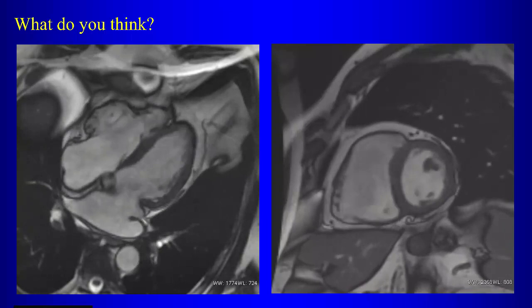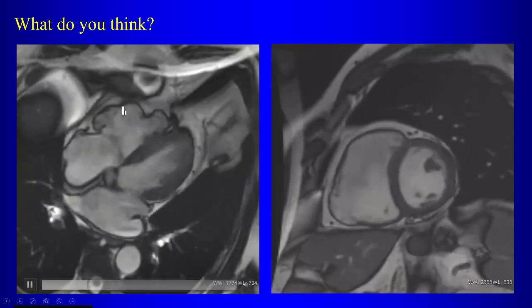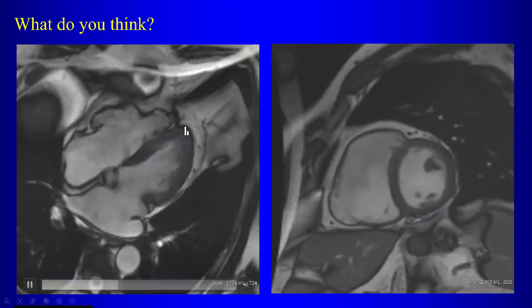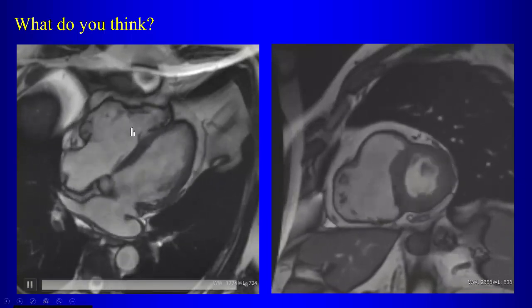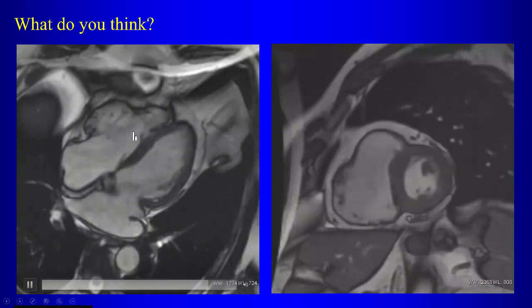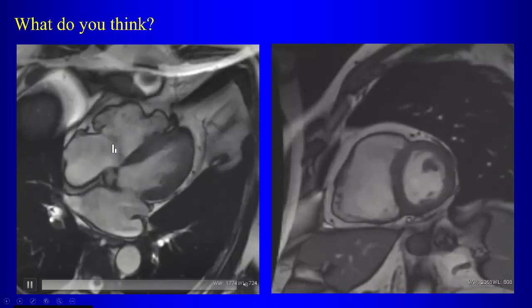Dyskinetic, yeah. So look how it's bulging out in systole, right? So you see these areas that are bulging out in systole. You said a magic word. You said it's kind of accordion-like, right? I said uncoordinated. Oh, uncoordinated, sorry. I said accordion. Yeah, you guys don't know what an accordion is anymore.